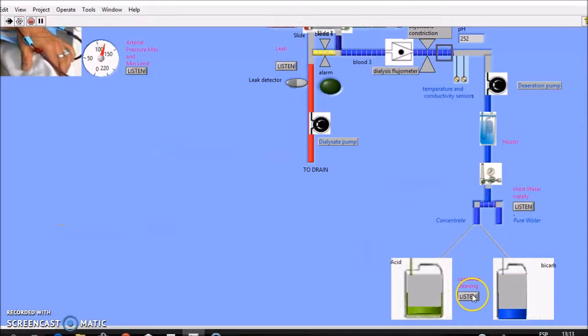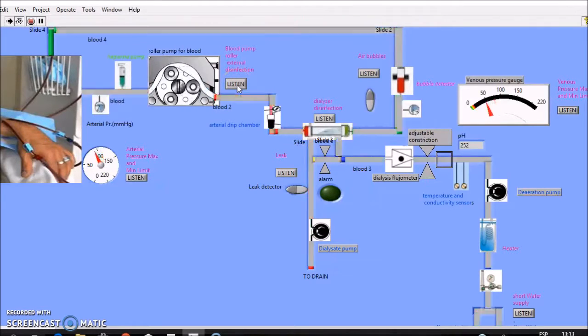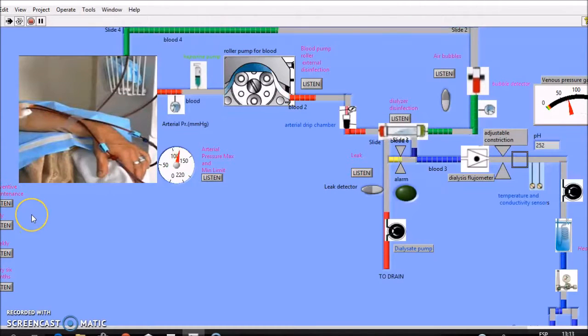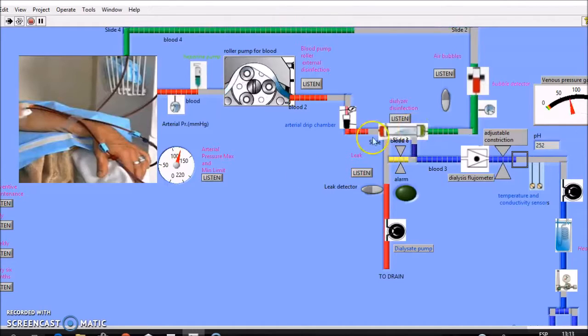Here is how to maintain the containers. Here is how the maintenance and cleaning of the blood pump should be done. Here is how to change some parts and how often the preventive maintenance is needed. And here it explains which disinfectants are suitable for dialyzer cleaning.